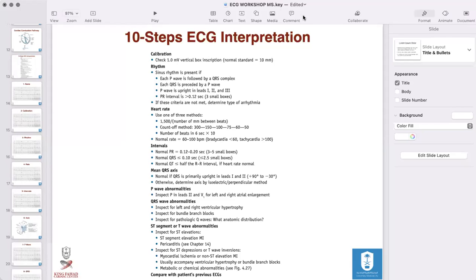Okay, and that's actually dynamic. This is a change, and maybe it's considered an ischemia. Some patients, especially women, we know have a baseline. Some of them have baseline ST depression, and if it normalizes, something wrong has happened. It can really be considered an ischemia. So that's how you try to compare, because seeing an ST segment without deviation by itself, sometimes it doesn't tell you, if you didn't have a previous ECG, if he has one. If he doesn't, then you assume what you see is his baseline.